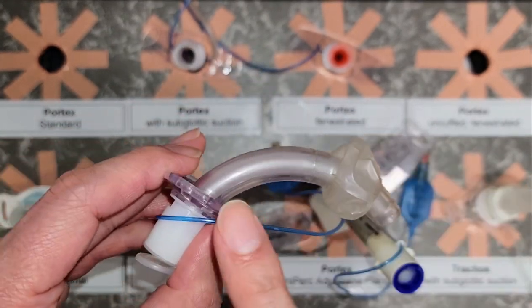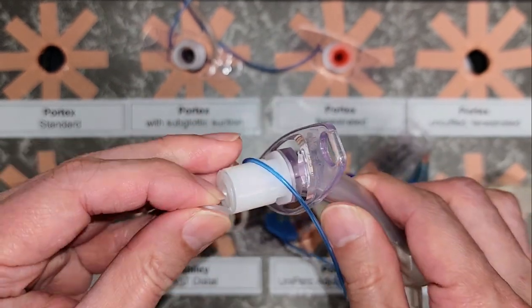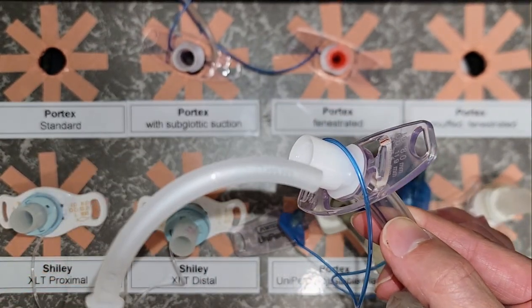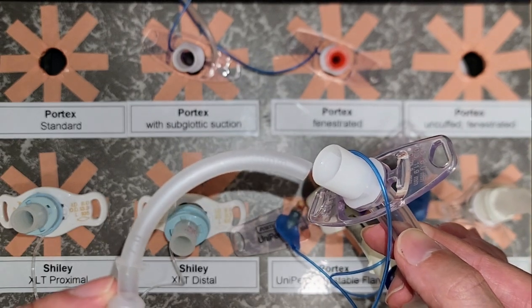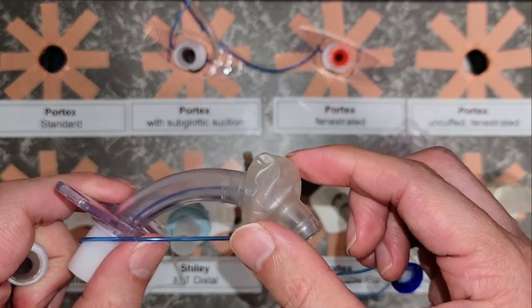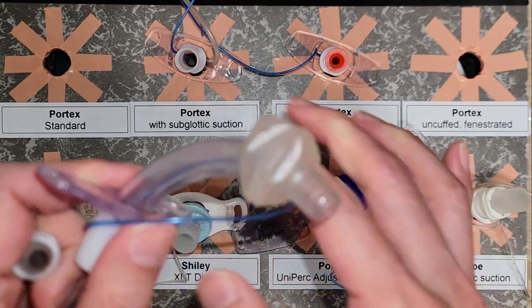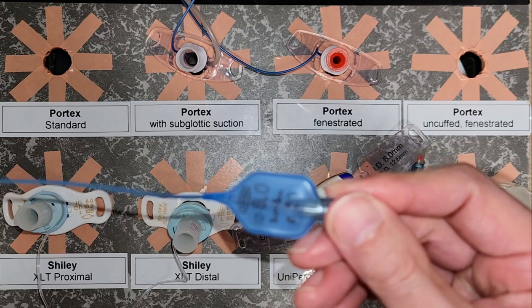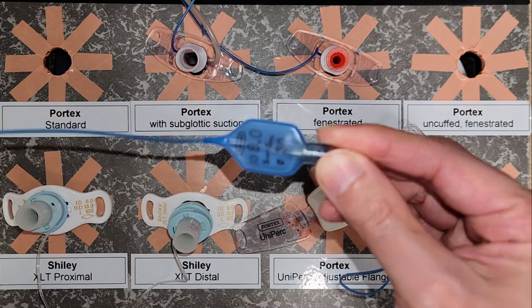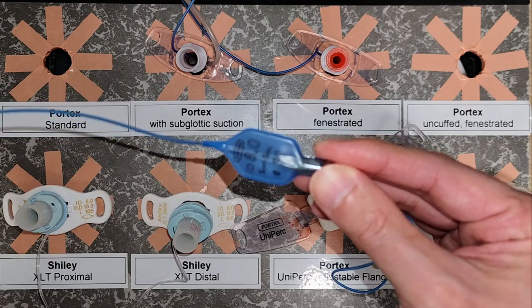We can see there is an outer cannula. There is an inner cannula that's placed within the outer cannula. And if you look properly, it says 7 millimeters in diameter. There is an inflatable cuff to protect the airway and prevent dislodgement. And finally, we see there's a pilot balloon that's linked to the cuff. The pilot itself contains information as well, including the inner diameter as well as the outer diameter.